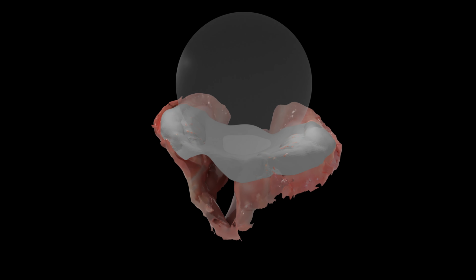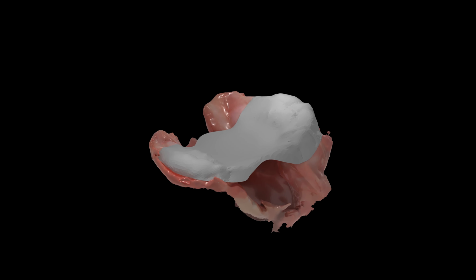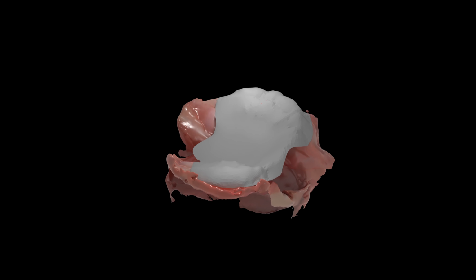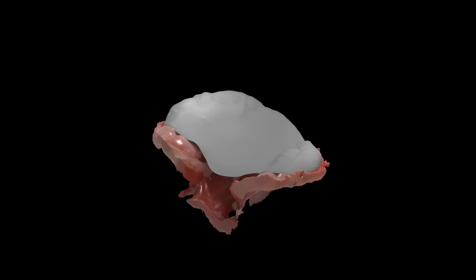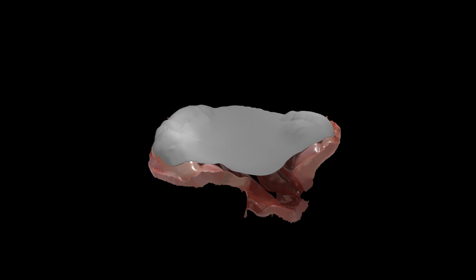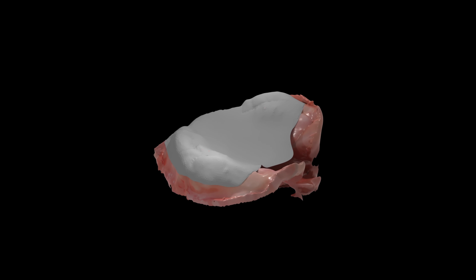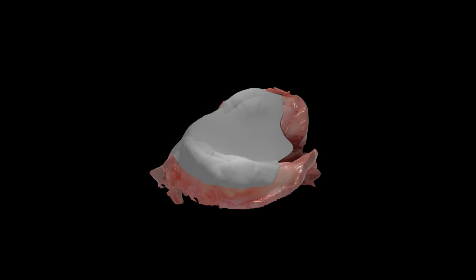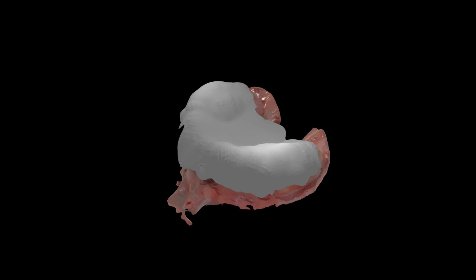We offset the plate by 0.1 mm to avoid creating harmful pressure points. To minimize the triangles' self-intersections during offsetting, we use a custom selective Laplacian smoothing algorithm to reduce the curvature in convex regions. We offset a copy of the surface by a custom 2 mm thickness and apply the same convex smoothing to it.